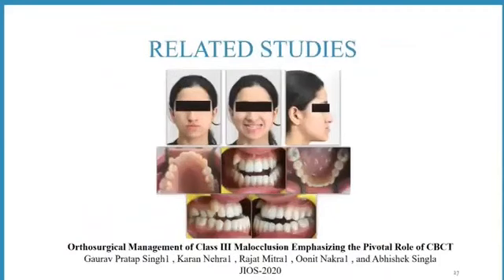Coming on to the related studies. So this is a case report of an 18-year-old female who presented with a chief complaint of a forwardly placed mandible. The patient had a mid-facial deficiency and a prognathic mandible.